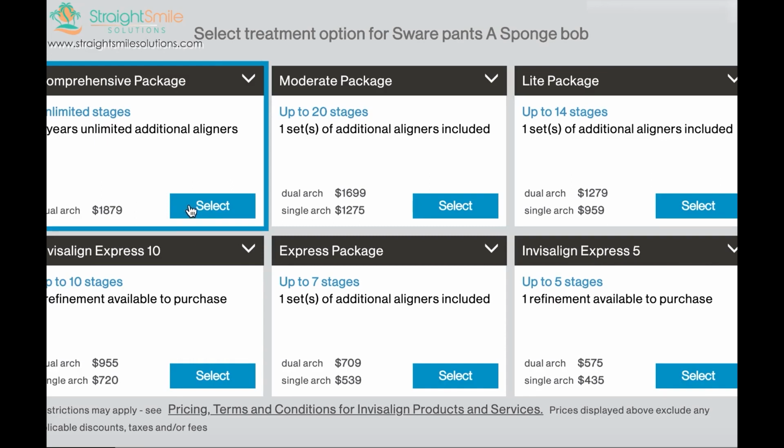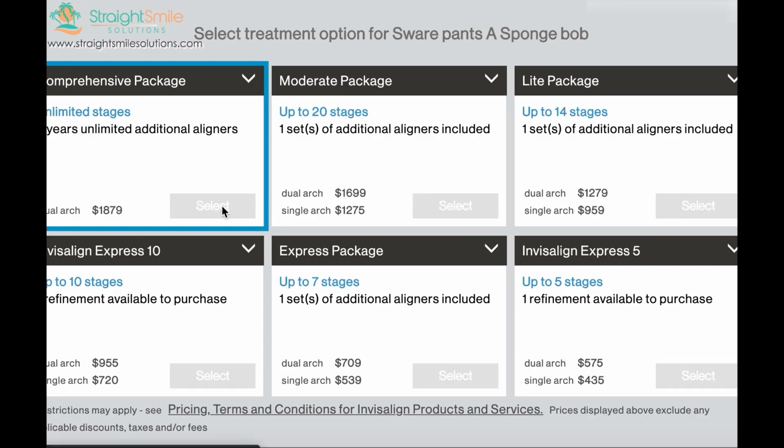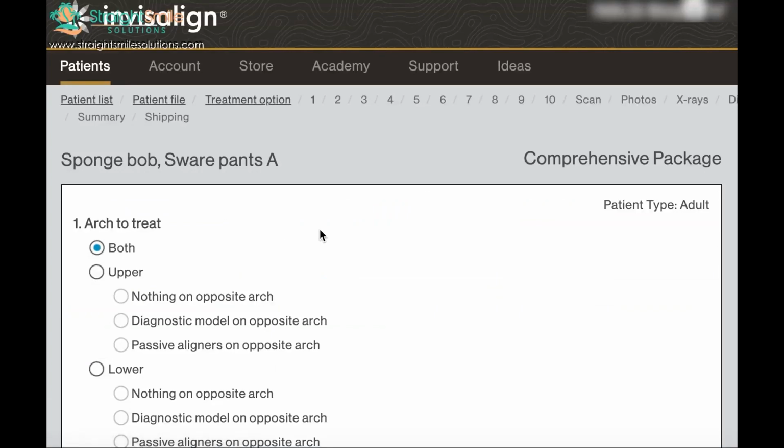And then we'll make the setup really, really good. We'll see what it takes, how many aligners it takes. And usually I'm going to add another 30, 40% because I find that cases track way better when you slow them down. Just a little hack. And ultimately you're using less aligners anyways because you do it right on the first try. So nothing wrong with that. If the patient is super compliant, you can always speed it up. So, but let's start there. Everyone's a comprehensive in my book.